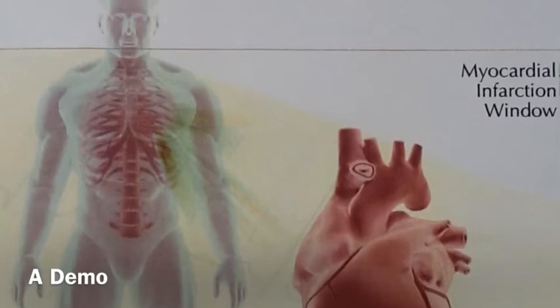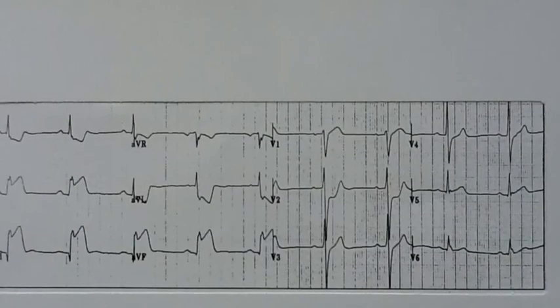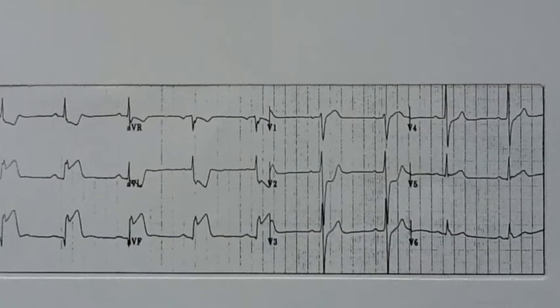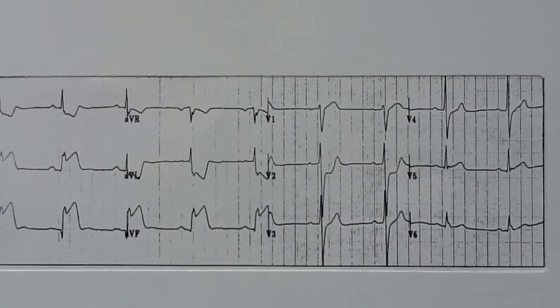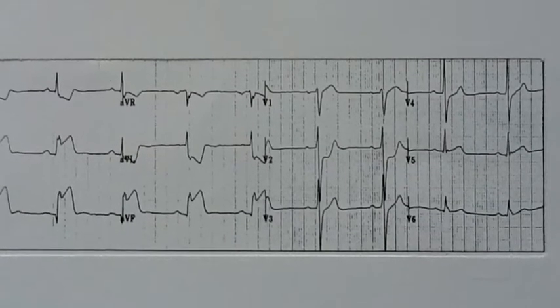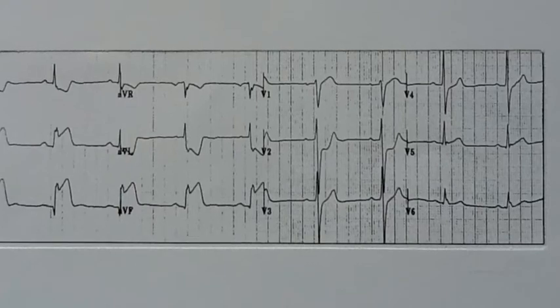Beneficial that I want to share how it works. The first step is easy. All you do is take your 12 lead and place it right on the bottom of the tool. So you'll put it right in the MI window.